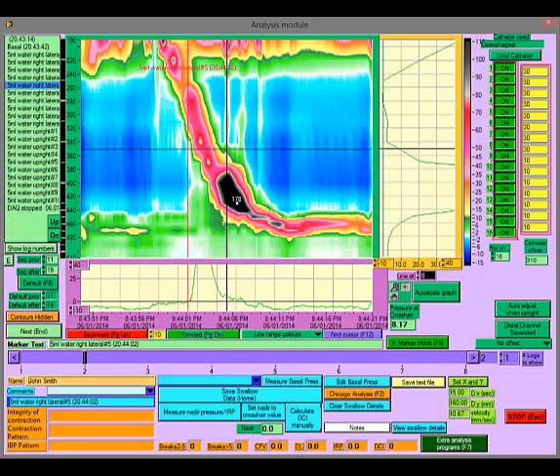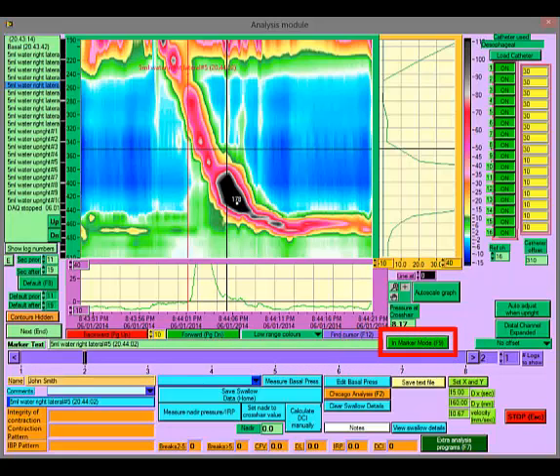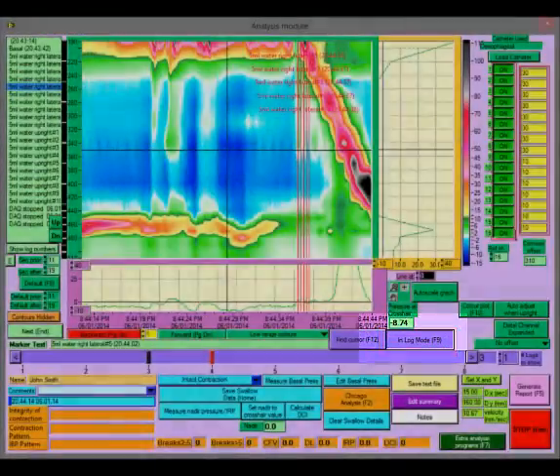To change to log mode, either click on the button marked in marker mode or click anywhere along the purple timeline. The in marker mode button will change to in log mode and the colour plot will update with new data.